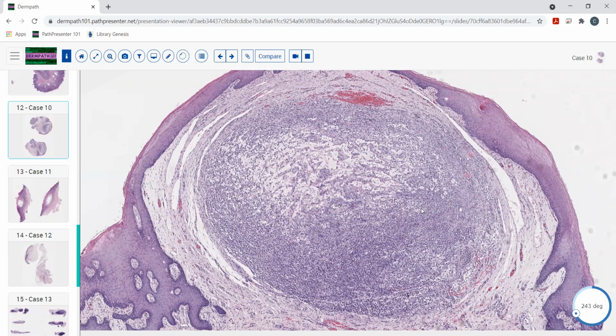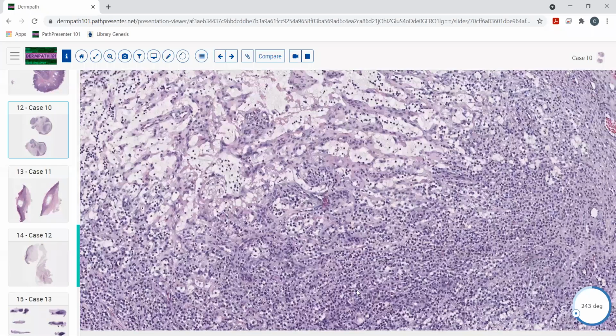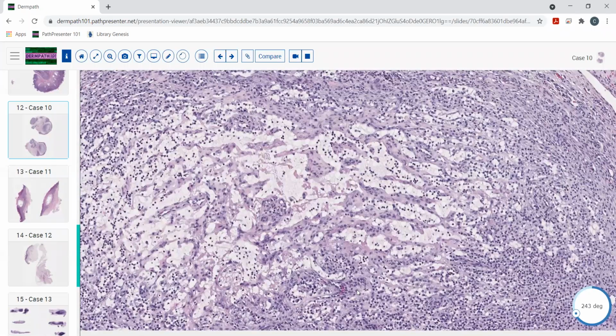But because they almost always don't last very long, they're kind of like bubbles, they rupture. By the time you biopsy it, it becomes a papule clinically, and these are usually clear. They look like bubbles clinically, small little clear appearing, almost like a vesicle off of the mucous membrane in the lower lip. And you biopsy it, and it looks like this. You see all of this mucin with this inflammation, even though it looks clear clinically.